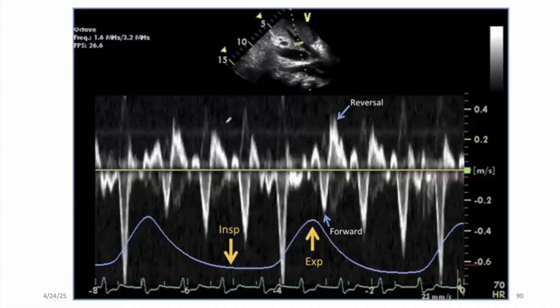And so here is a nice hepatic vein Doppler of a patient with constriction. Okay, let's do our thing. We're going to draw a line at a structure that we understand. So I've drawn a white line here, as you can see, on our P wave. The first positive wave that we should be seeing is an A, then we have an S, and then we have a V. And in constriction, you have this really predominant D wave of diastolic flow.